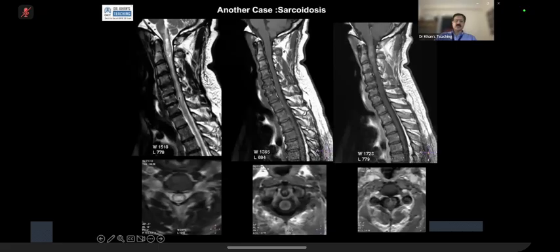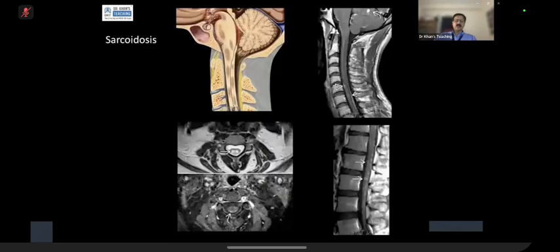You will report it as a tumor, by the way. If you report it, oh, I'm worried about a tumor. If you see, there is enhancement here. And this was a sarcoidosis. On this particular example, you cannot discriminate it. But please remember that sarcoidosis can cause this. Look at this picture from StatDX.